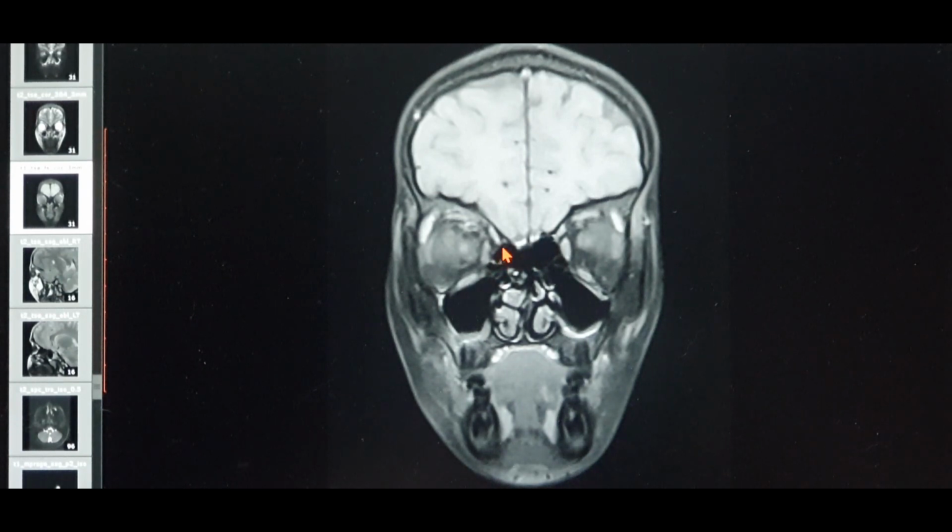So these are certain basics of MRI. Similarly, you cannot see bone on MRI. As you can see over here, that's the brain, that's the globe, the orbit. You cannot see a single bone. What you can see is a thin black rim over here.